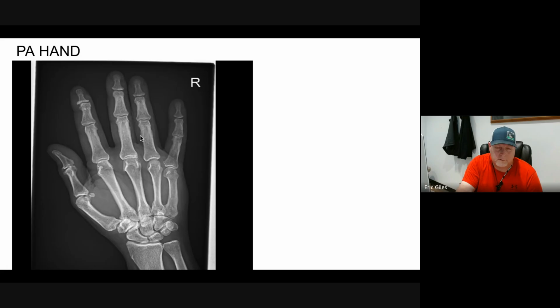It's not the end of the world. I would not redo this image. It's just something to work on going forward. Make sure that those fingers are equal distances apart. Okay.